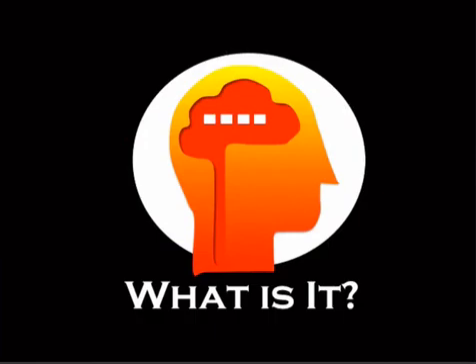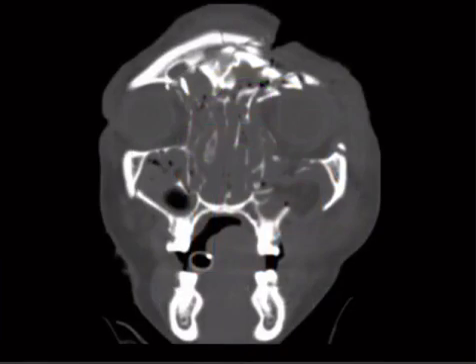All right, moving on. This guy here, that's a face only a mother could love. He's had a bad face smash, and the question would be, what kind of Lefort fracture does he have? Now, Lefort was developed with some medieval guy throwing skulls off a castle wall or hitting them with clubs. Most trauma that occurs today is from car wrecks, right? So it's a different mechanism than getting hit with a club or having your head thrown off a castle wall. So it's medieval, it's outdated, it's a stupid classification system, and as a result will likely end up on your test, the quote test of the future.